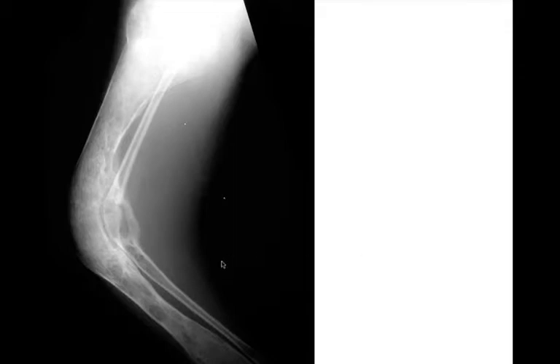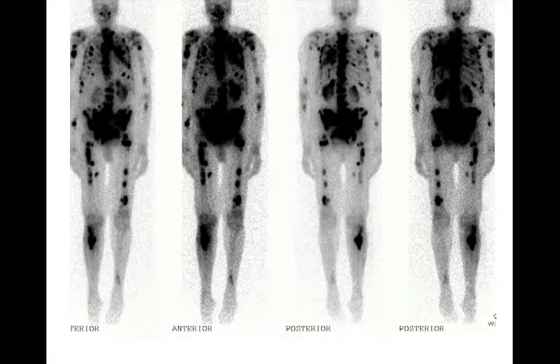All right, we saw this one earlier. Again, long lesion, long bone, bone deformity, typical fibrous dysplasia. So something like this, you can really have a good shot at saying, hey, this really looks like fibrous dysplasia. So polyostotic, right? It's also involving the fibula. You saw this bone scan earlier. This was the metastatic osteosarcoma from the one that was in the tibia.